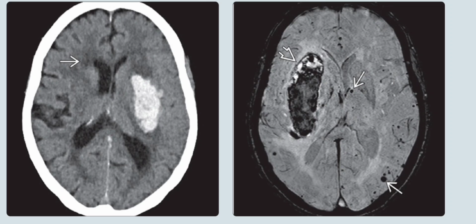Right image is the axial SWI image, and it shows a large hypertensive basal ganglia hemorrhage as well as multiple foci of susceptibility artifact from hemosiderin deposition related to microhemorrhages from chronic hypertension.